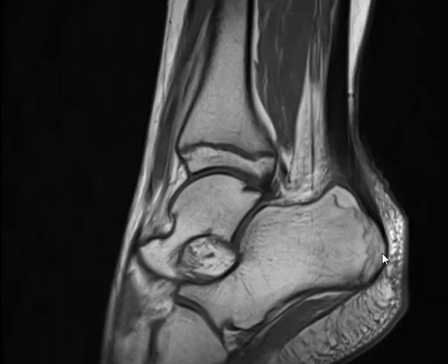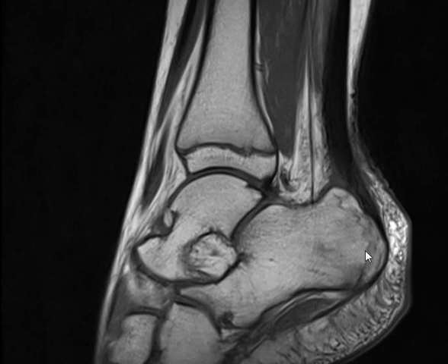It could be some of these cracks. You can see bilateral apophysis. There are some thin linear cracks. Most likely these are not all due to growth plate. Some of them are fractures.